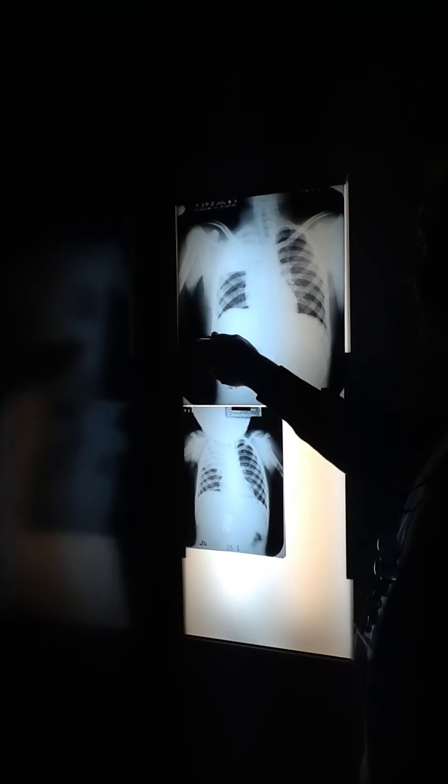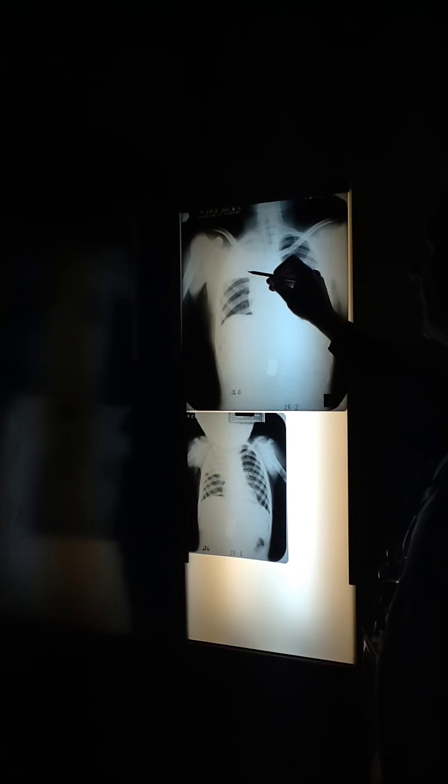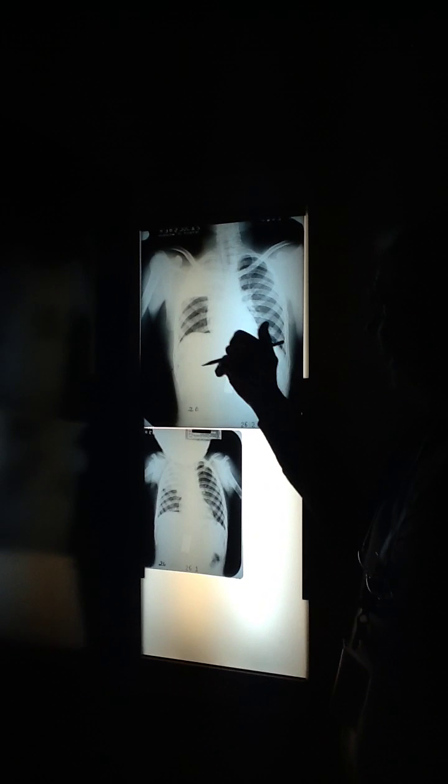That looks like this and this, doesn't it? I don't see any lucency mixed in here. Now it's not as bright up here because what? Well, isn't the lung thinner up there? Doesn't the lung go like this as you go up to the top? So it's thinner there than it is here, isn't it? Yeah. So we go up like this and it's thinner. So it's not as dense up here. But I don't see any lucency in there.